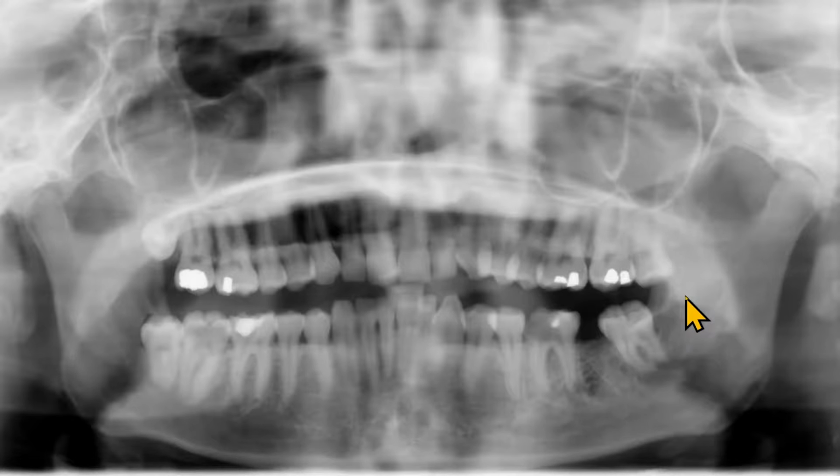This is an example of less severe chin up. We can still see that the patient is not smiling, so the occlusal plane is pointing slightly upwards. And look at the hard palate, it's pointing upwards around the midline of the film. On both sides, the posterior borders of the ramus have slight distal tilt.